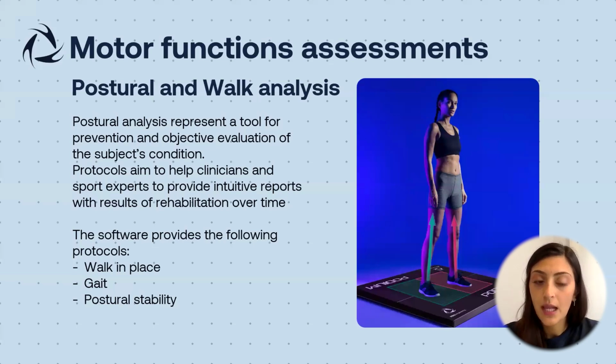Then the system also allows a postural assessment and a walk analysis. Postural assessment represents a tool for prevention and also allows to get an objective evaluation of the subject's condition in a static position. All these protocols aim to help both clinicians and sport experts to provide intuitive reports and help also visualize the progress of the rehabilitation over time. In terms of protocols, the software provides walk in place, gait, and postural stability.